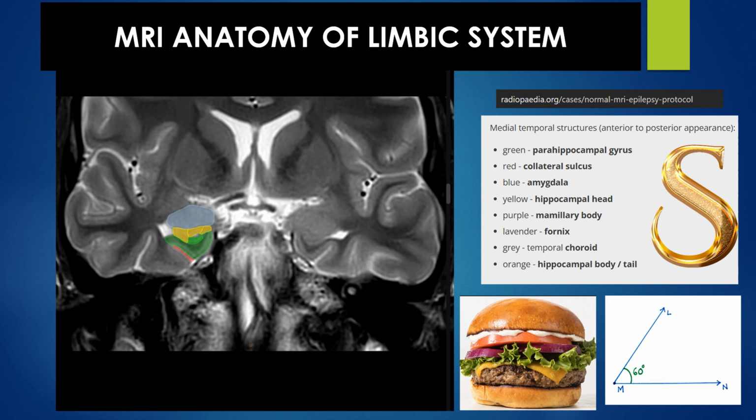This is the starting of the next level of structures. So this is the amygdala. Then whatever we are able to see, we'll see this better in the next scroll, will be the hippocampus, and the more inferior layer of the patty, the inferior bread, is going to be the parahippocampal gyrus. There is another small structure, which is the dentate gyrus, which is shown in dark green here. We'll look at that later actually. As of now, if you remember amygdala, hippocampus and parahippocampal gyrus with the collateral sulcus, that is more than sufficient right now. We'll keep on adding more structures later.